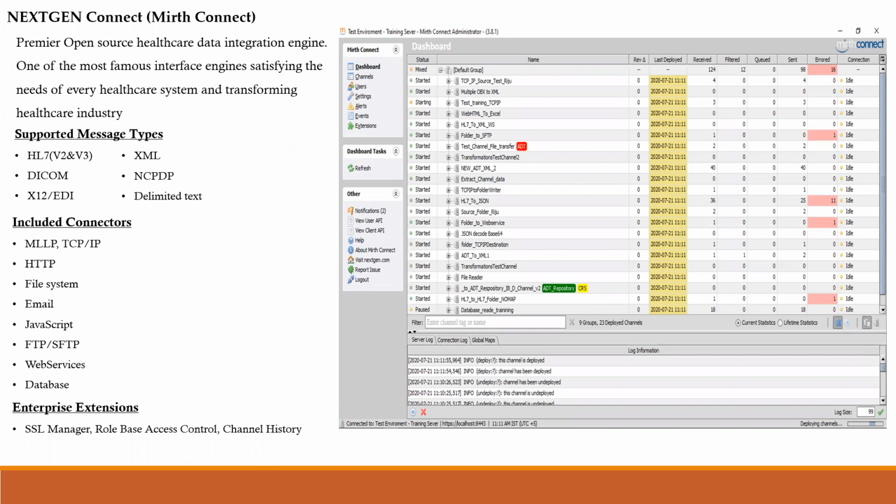So that being said, along with the formats, we also need to have the flexibility to connect using the various connection models that are available in the IT industry. Mirth Connect can receive and send data using connection models like TCP/IP. It can receive data through TCP/IP and send data using TCP/IP. It can receive data through HTTP requests and send HTTP requests outside.